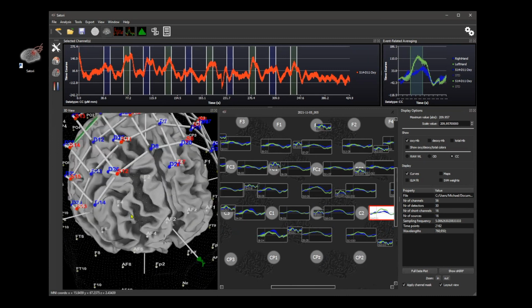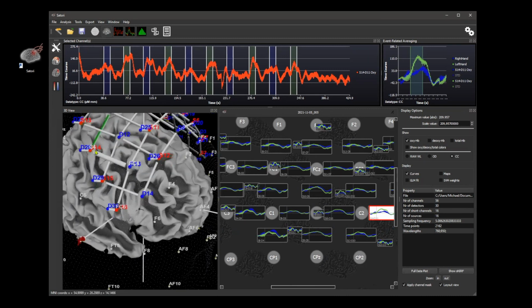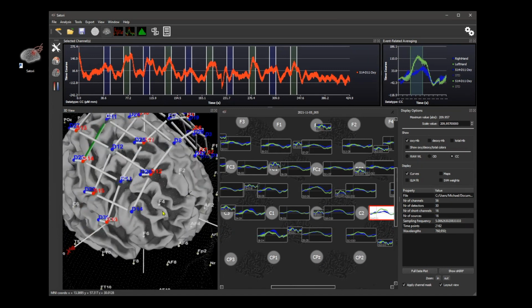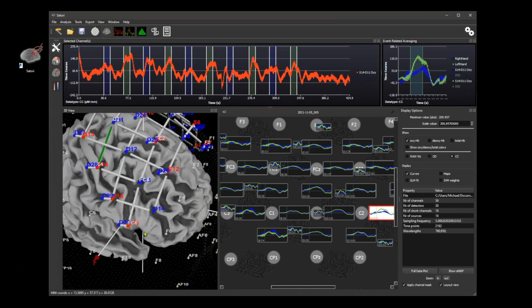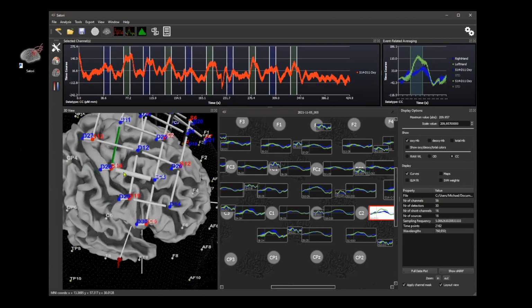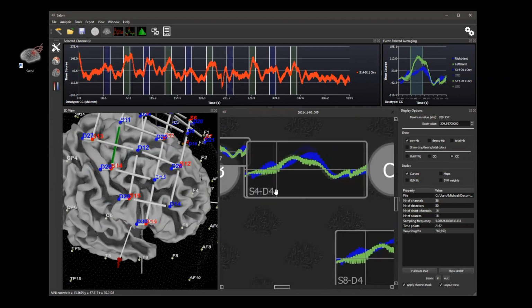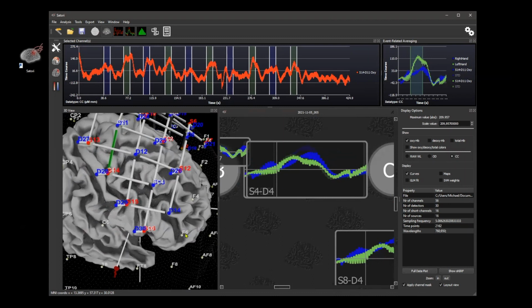And for this data set, we have for each source a short channel as well available. One also interesting design in this data set is that we have crossing channels. So this is a redundant set. This is also why you have here two sets lying on top of each other. But to see this easier, we also have next to the 3D view, a 2D view.